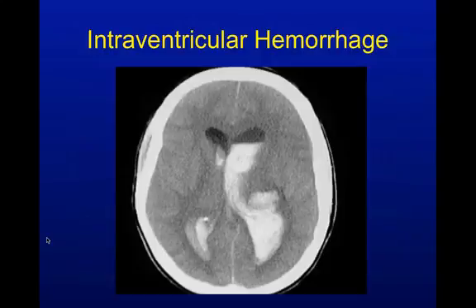Okay, so here we have blood inside the ventricle itself. I mean, it's packed full. This person's going to need a drain by the neurosurgeon. He's going to have a very small target to hit because all this blood's going to clog up the rest of the drainage system of the CSF. So they're going to build up intracranial pressure massively. So this is quite ominous. From a parenchymal bleed here posteriorly. And again, there's some edema there in the tissue of the brain itself.